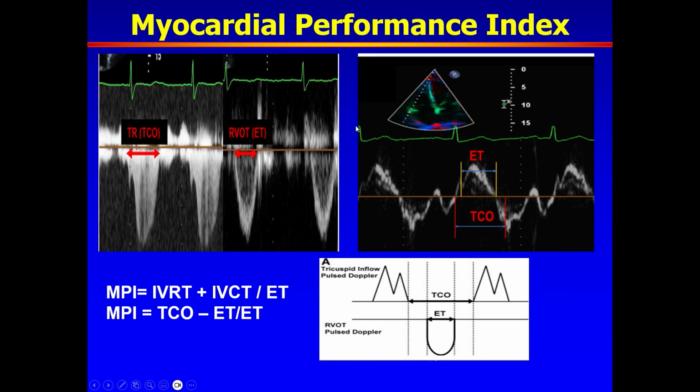To circumvent this issue, if I am doing multiple cycles and multiple measurements, what about I just go to the tricuspid velocity signals by pulse wave Doppler, and here I get the ejection velocity, isovolumic contraction, isovolumic relaxation, and everything is obtained from the same cardiac cycle. It cuts that issue.